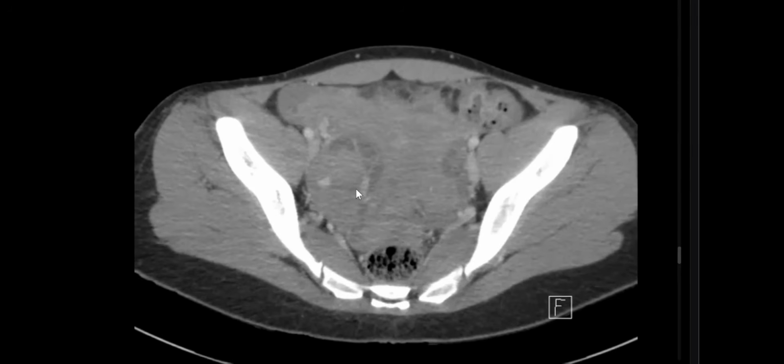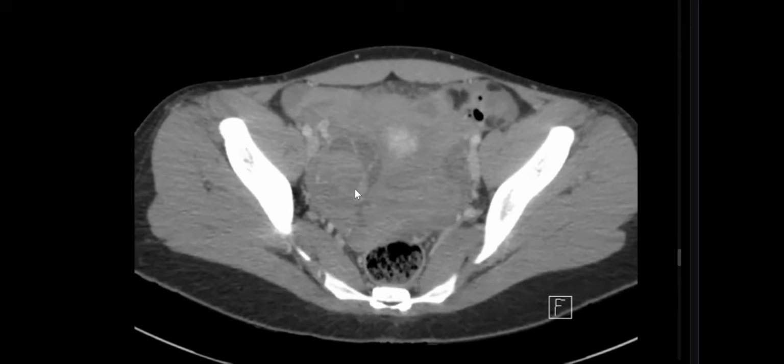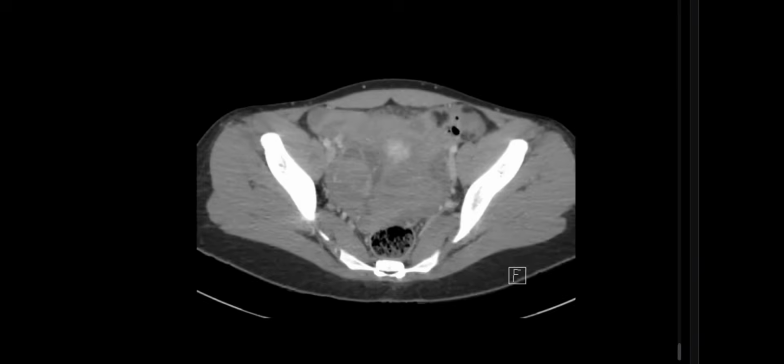So in my routine practice, I will ask about complementary ultrasound, for example, or previous studies. Okay. I'll give you the ultrasound. Just a minute. Give me the mouse, please. Okay, leave the mouse. I'm leaving it. Thank you.